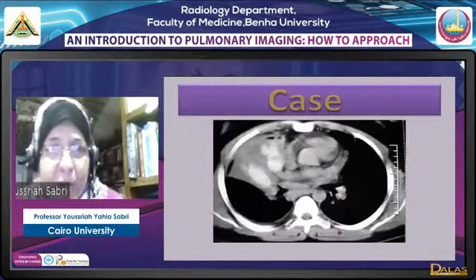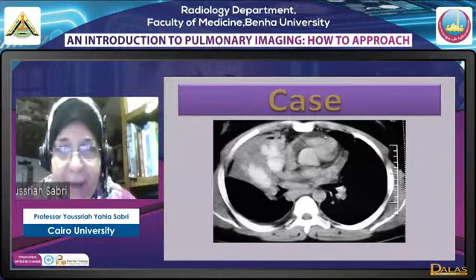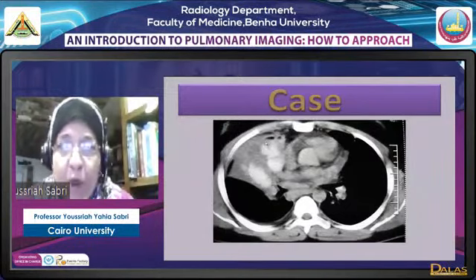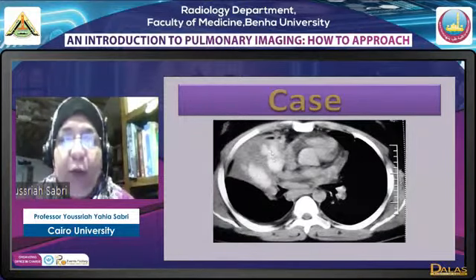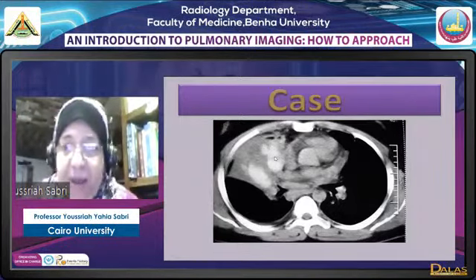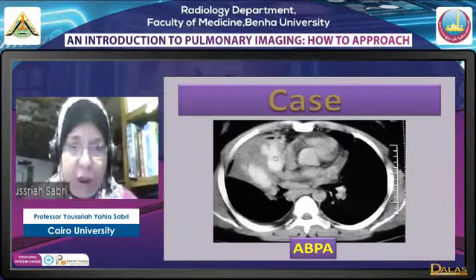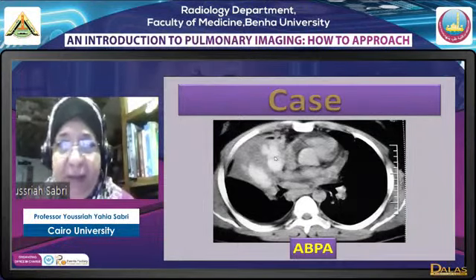complicating this infection. Now, this is a very interesting finding here. This is the heart, so this is the middle lobe. Okay, inside this middle lobe, we have consolidation with an element of volume loss. Okay, and we have tubular structures that are branching and that are white. This appearance is pathognomonic of allergic bronchopulmonary aspergillosis, which is one of the appearances of aspergillus affection of the lung.